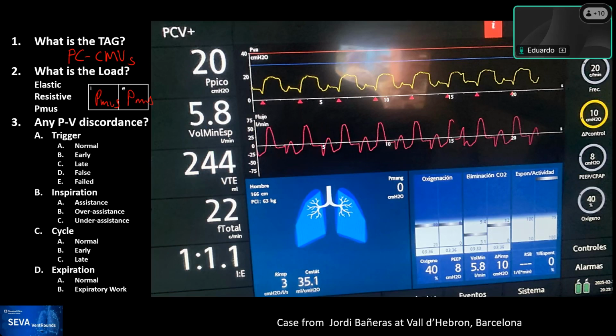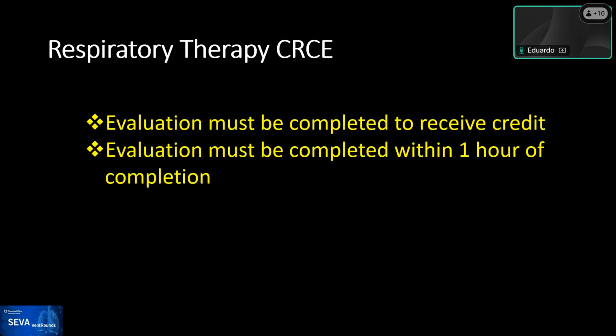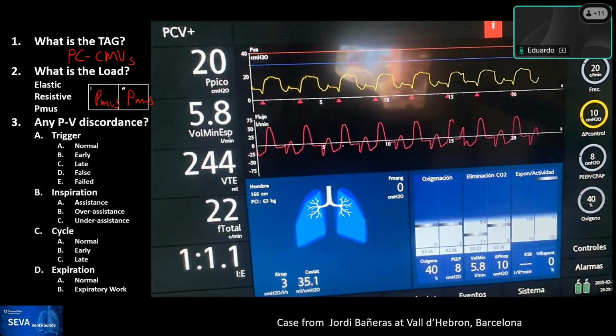And you know that because you don't see, and I'm going to go back one slide, this beautiful, nice decay during inspiration. Instead, you see this kind of sinusoidal waveform. So I'll go back to the image that we had. Even though this is the gain in this ventilator, it looks relatively small, but you can see that sinusoidal shape instead of an exponential decay. And then during expiration, you barely see a little phase for expiration, so you cannot really see if this is a decay or the patient is doing effort. Rob?